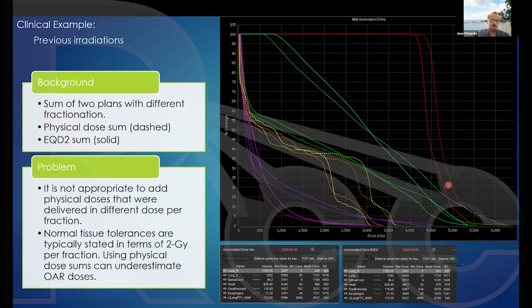So you see that if you add physical dose instead of biological dose, you're not getting the same numbers. Look at the OARs, look at your targets. Everything is different. Very, very important that you convert to biological dose. And I will tell you something else. If the dose per fraction is 1.8 or 2 Gy per fraction, still convert to 2 Gy per fraction.